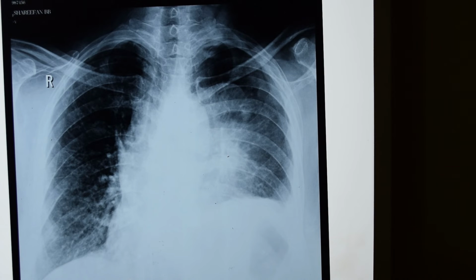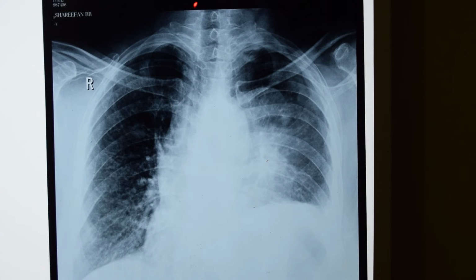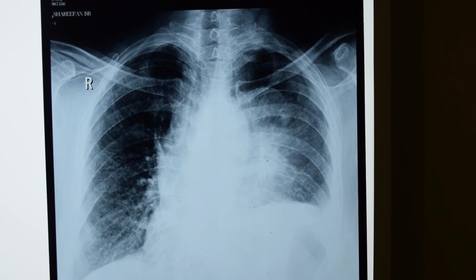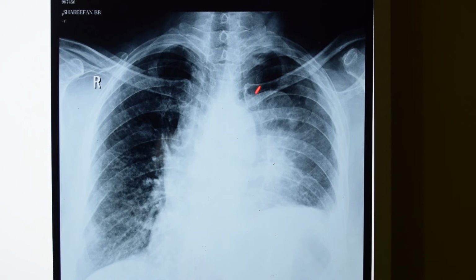So this is another chest X-ray, and here you can see there is some lesion. This is the trachea, and this is the heart, a bit rotated film, and here you can appreciate a small thin line over here. This opacity is attached to the hilum, so any opacity which is attached to the hilum must be considered as a lung mass.